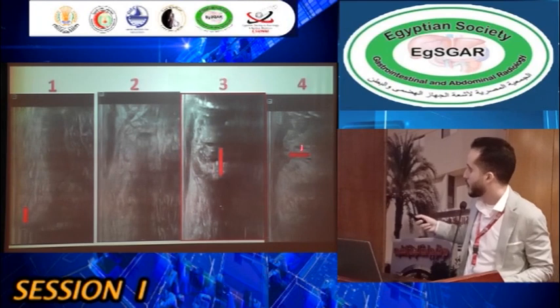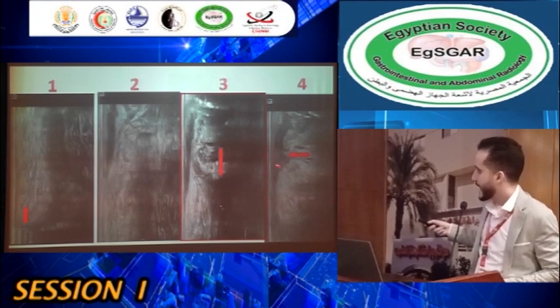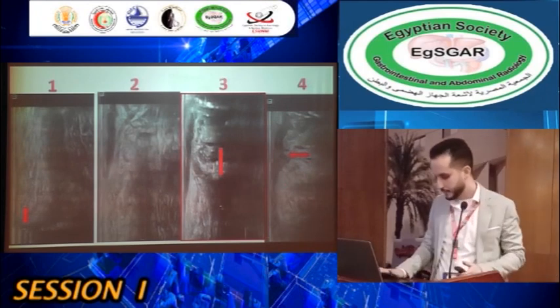In image number 4, we can see that this secondary tract is also traversing the internal anal sphincter with a defect in it. Here we can also detect the exact location of the internal opening, and it was a 4 centimeter distance from the anal verge.